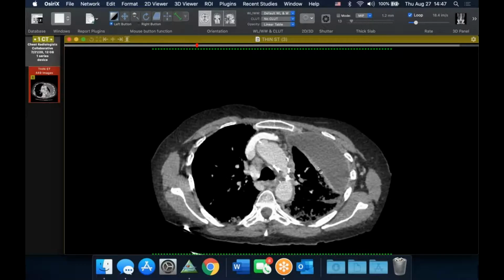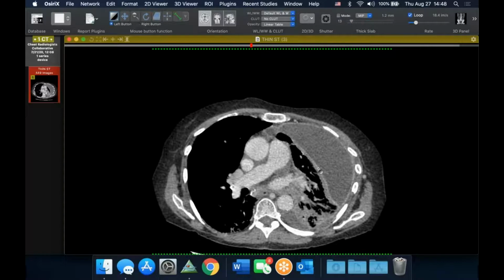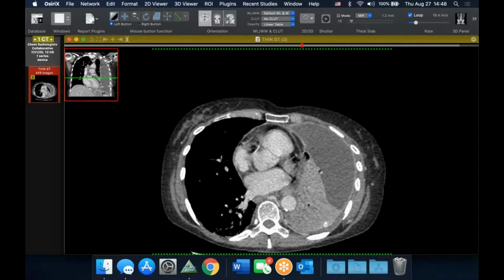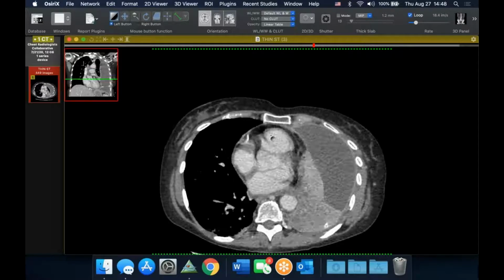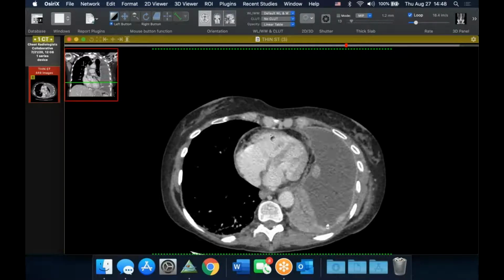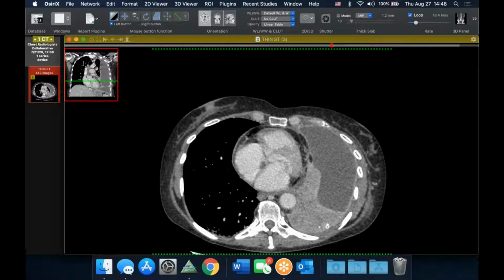But from talking to the interventional pulmonary fellow, the site was pretty red and angry, and there was a lot of just pus and stuff. So super infected. But I've not seen a Pleurx ever get infected before. So this one happened to have imaging. So just something to add to your list of things when you do see drains in chronic things, is to make sure you check not just where they're located, but follow the track there, because it'd be very easy to overlook that when you have all this going on in here.